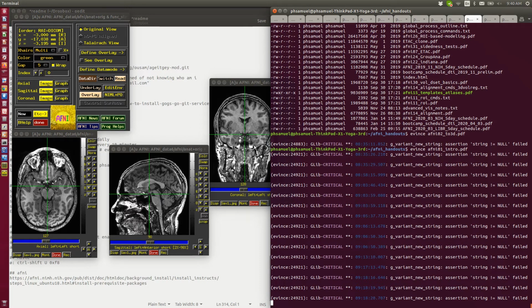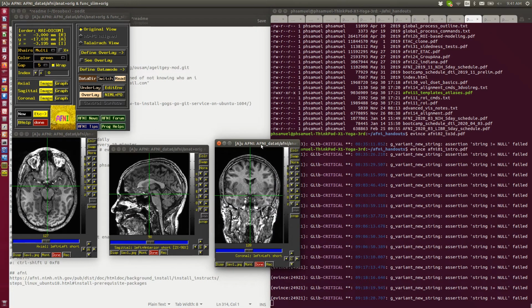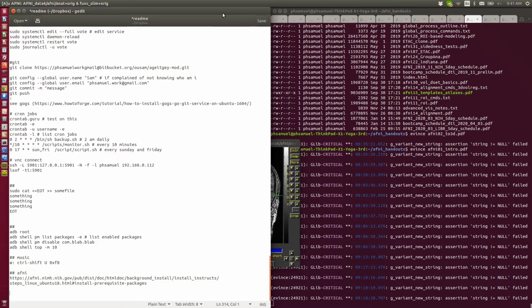So axial is horizontal, or sometimes it's called horizontal, because if you're standing, that is horizontal. Although when you're in a scanner, it's vertical actually, right? So then sagittal and coronal. These open up image viewers to look at images in these standard orientations. They pull the data out of the 3D volume based on how it's stored on disk, so that it can be flipped around in various ways. As long as the header file has it oriented correctly, it should draw these out in this kind of view.